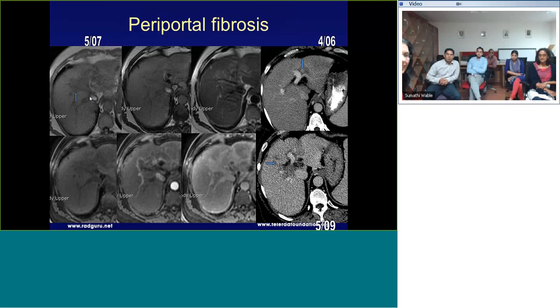So at least when you're aware of it and you look for it, fibrosis usually enhances slowly. So that's another thing you want to think about when you see that delayed enhancement that is retained. And this is the reason I like the routine extracellular gadolinium, because we know over several years of experience how these things behave. And if everything goes and sits in the liver, then it would be very problematic.